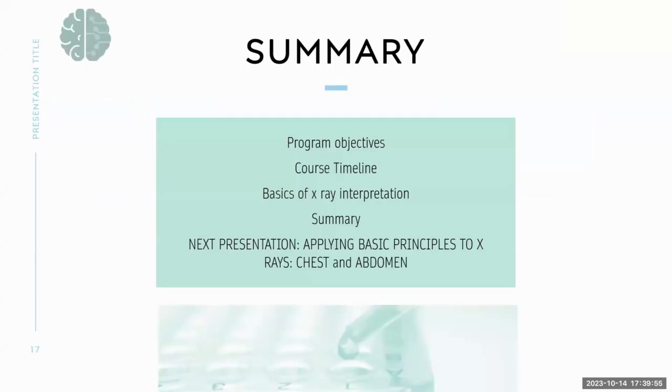All right, perfect. Thank you, Karthik. So before we talk about a summary, the key thing, for those of you who've just listened to the last couple of slides, is what this terminology actually means. We've given you a couple of examples, and they're pretty easy examples just to warm you up. So: opacities, lucency, and you can refer to tissues in between as translucent as well. A lot of the time, when we're looking at X-rays, we might not necessarily know the exact diagnosis straight away, so you will be required to give a basic description of the X-ray initially.